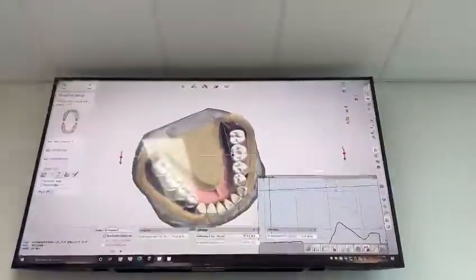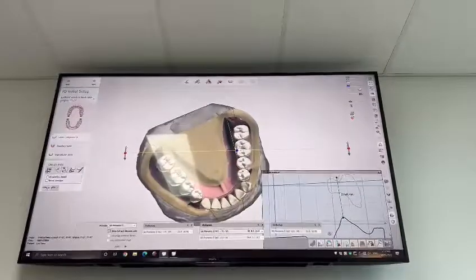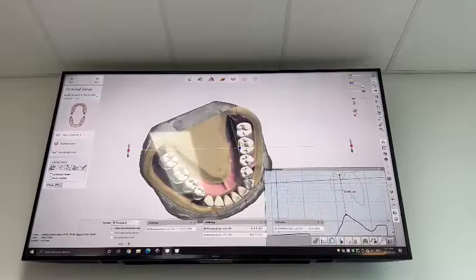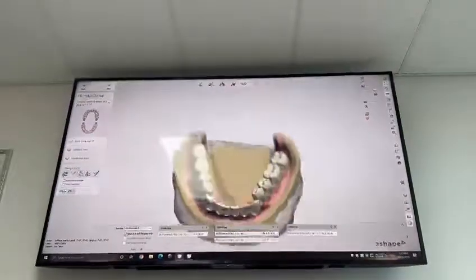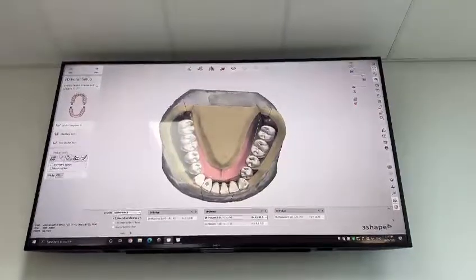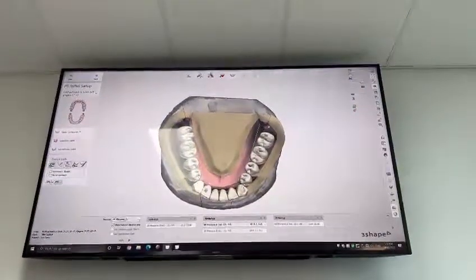You see here, ridge. Can you see what I'm saying? That's what we're trying to achieve here, guys. So we've got those teeth set over the ridge. Now, look at our anteriors. Not real good. Oh, they want to come in.